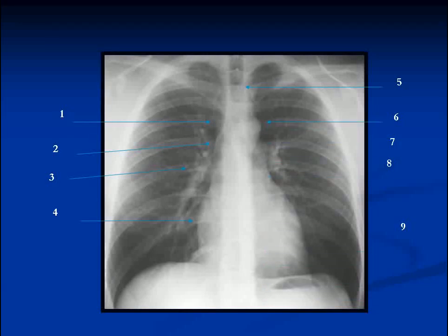The little notch here is formed by the aorta, which we can see in relief. And again, the reason we see the aorta so well is because there's air next to mediastinal soft tissue.